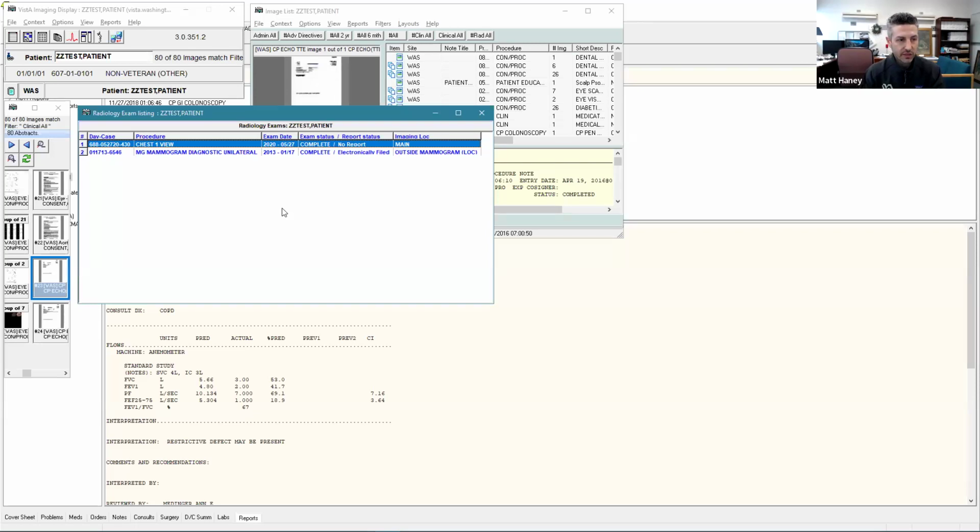You can do something similar for CT scans. CT scans, again, in this top area, have a view setting where you can change to abdomen, chest, head, whatever you want your view setting to be for the type of image you're looking at. And if you select the first image in the set of thumbnails, you can also do a side-by-side comparison of CT scans. Your slices might not line up exactly, but there is a mechanism to do that.